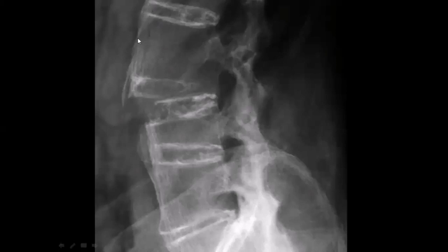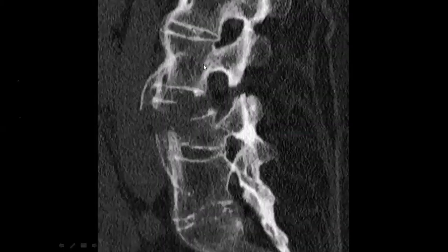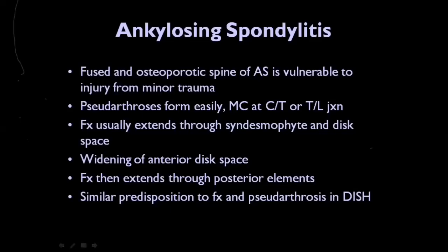And also if you follow the distribution of the anterior longitudinal and posterior longitudinal ligament, the disc calcification is also very characteristic in ankylosing. If you see disc calcification, you should think about ankylosing. They like it much in the exam. So please don't forget ankylosing. One of the tricky things is that they come to you in the MRI without X-ray, without CT. So this is more tricky. Ankylosing, they like it. Disc calcification, one of the keys.